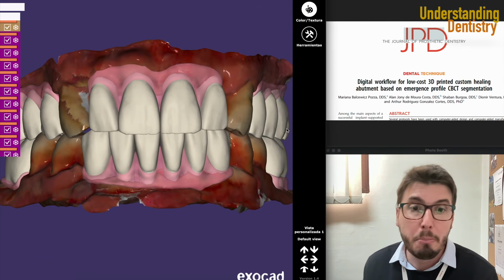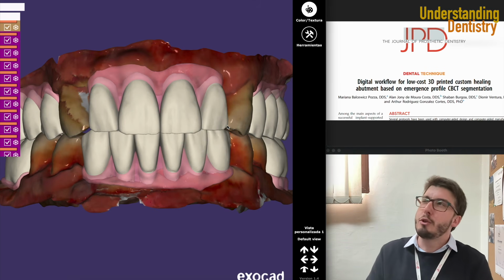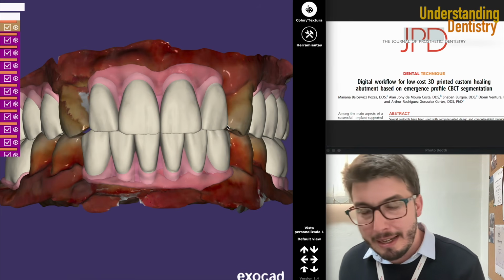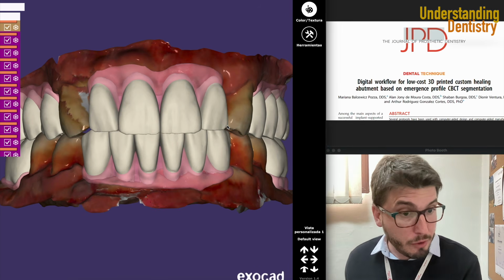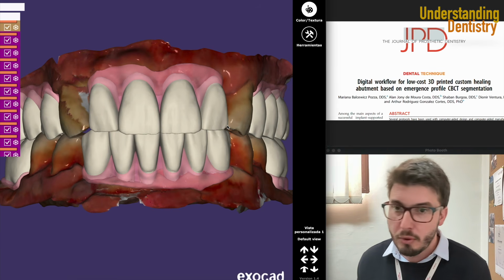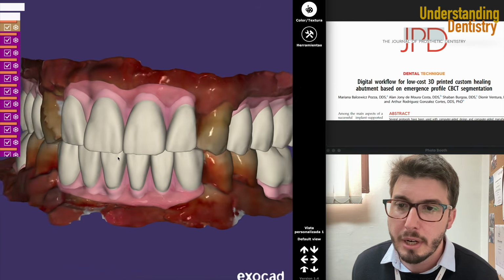Principles of occlusion, bilaterally balanced occlusion, of course, you want contacts on both sides. You would try to go for tripodized contacts, but sometimes that's not possible, so you would prefer cusp to fossa contact instead of cusp to ridge, to the lateral ridge of the cusp of the molar, of the crown. Those are very important criteria.